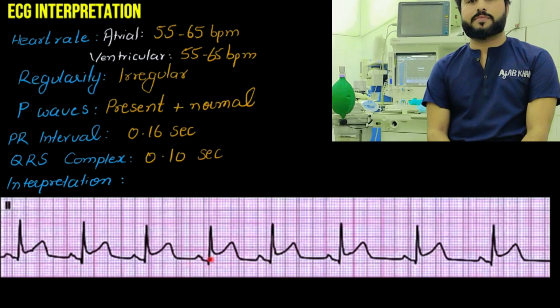If you look at the QRS complex, this ECG is actually having ST segment elevation MI. This patient is suffering from an MI, but we are not going into the detail of MI because we'll discuss ECGs of myocardial infarction in a separate video. In this video, we are only going to target the sinus rhythm, the sinus arrhythmias, the sinus blocks, and sinus arrest. So you have to ignore the ST segment elevation for now.